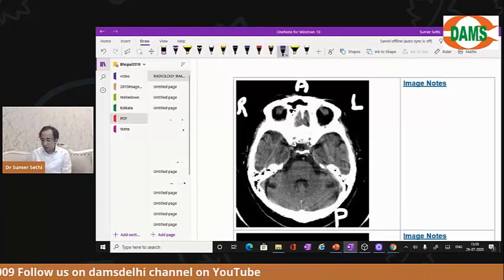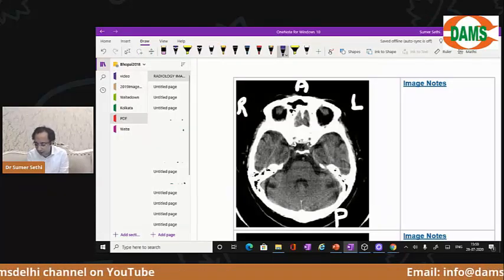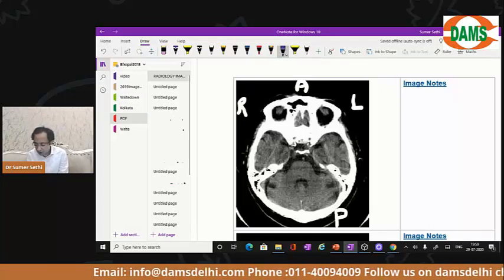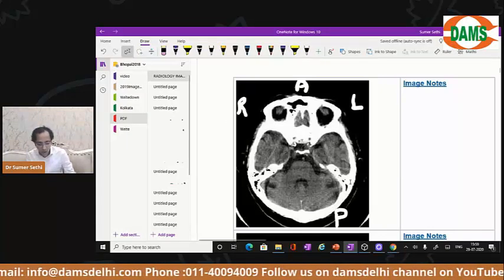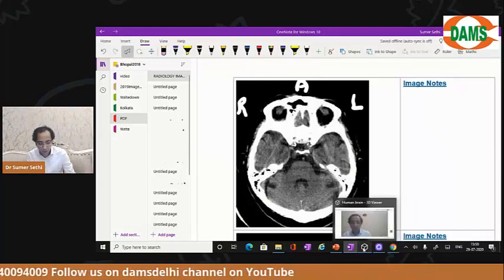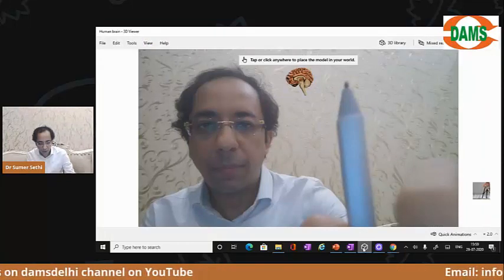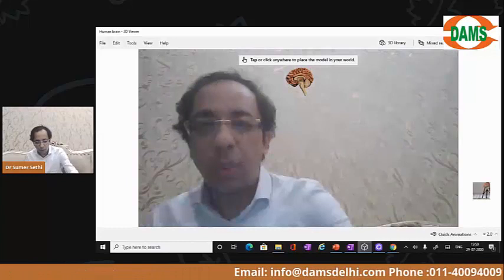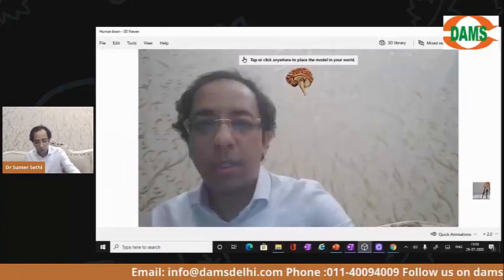Once you get oriented to the right and left, I want you to quickly look at an image with me. I'll quickly show you an image here. Let's see.